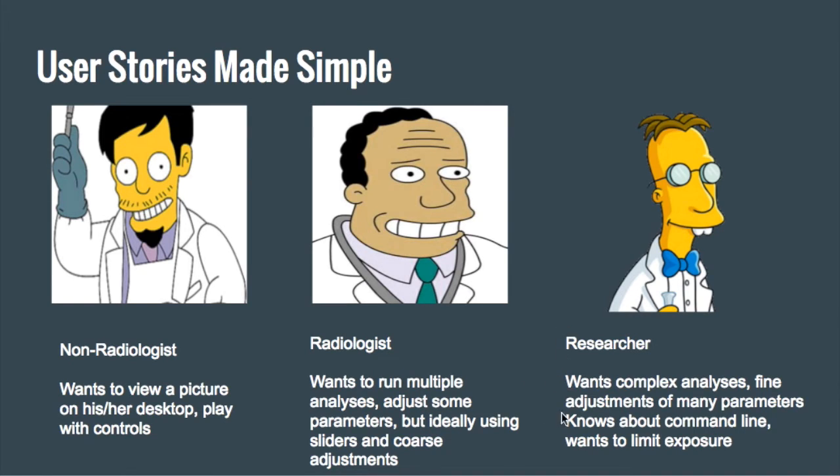For researchers, CRIS provides some additional benefits in that being able to load scripts for FreeSurfer, one of the main utilities used, and many of the other plugins, allows them not to have to deal with a lot of command line. And in particular, with working with these programs, the command line can get very, very messy very quickly.